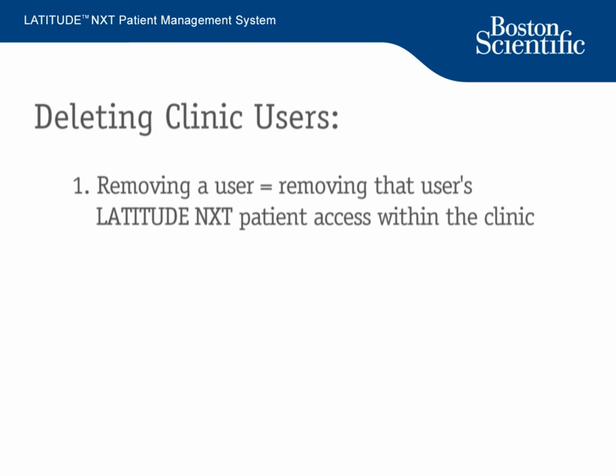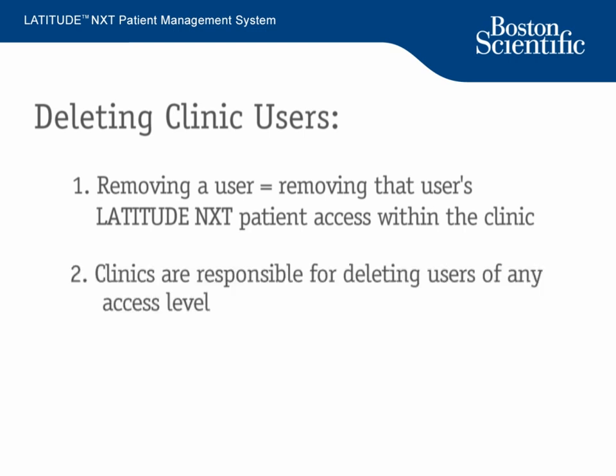There are 2 important things to know about removing users. First, removing a user's account removes that user from all access to patients and deletes the user's account from the system. Second, it is the responsibility of the clinic to ensure that accounts are deleted for users who are no longer employed by the clinic or should no longer have access to patient data in the Latitude NXT system.